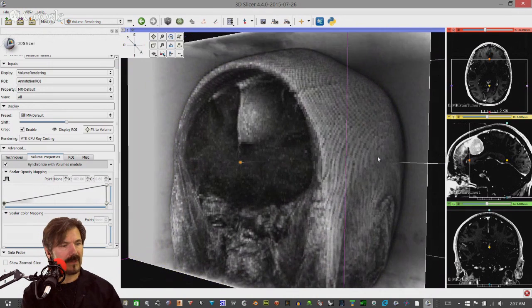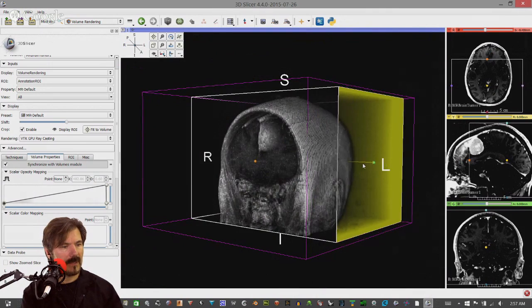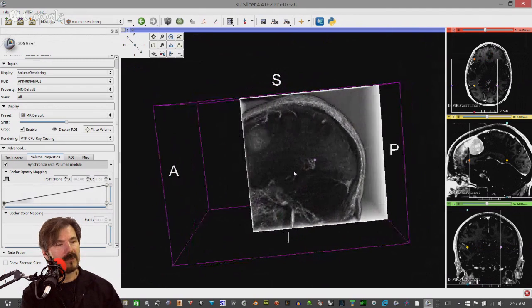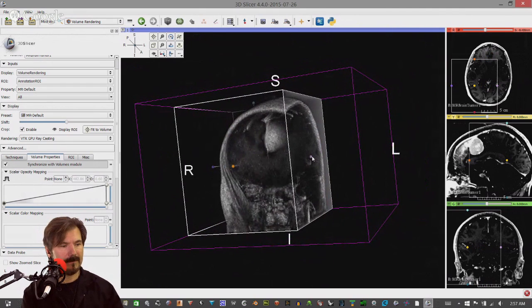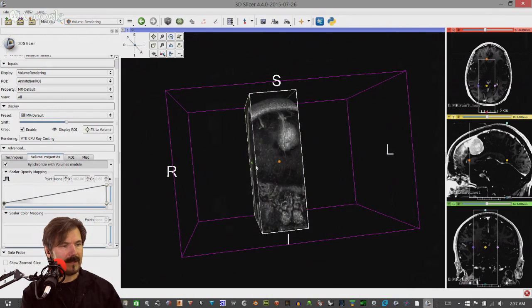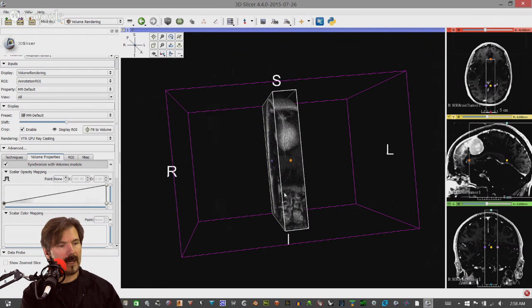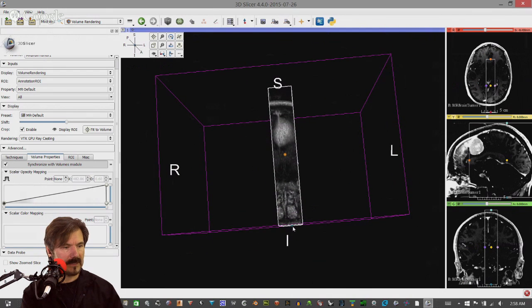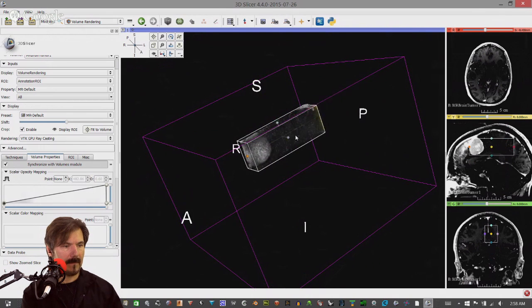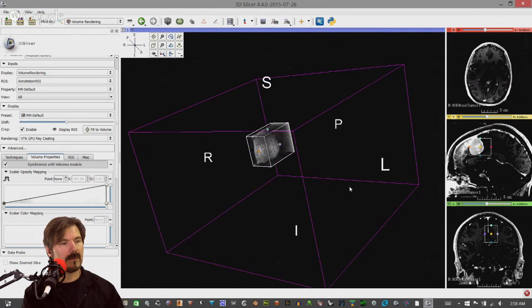And then we want to get further in on one side. So we can literally do virtual surgery here. And so what I was doing earlier, and I think I can get to the same point, is if you do enough ROI segmentation, I should be able to isolate just the tumor itself. Voila.